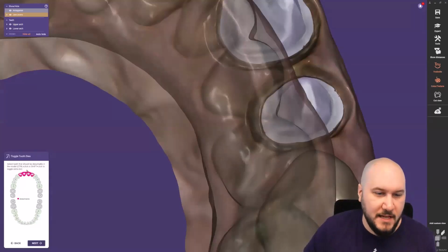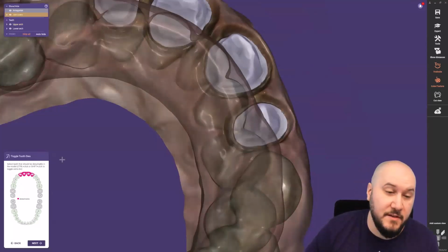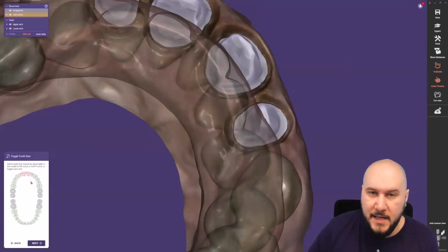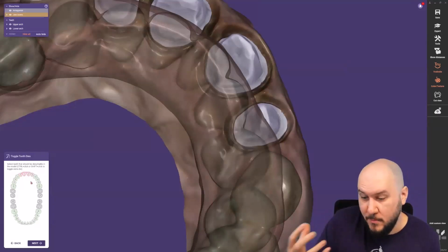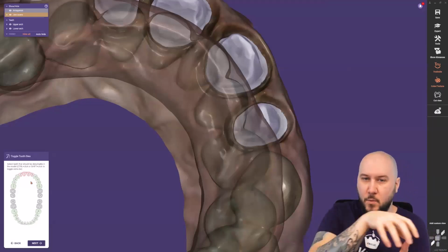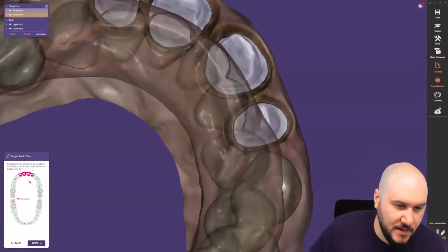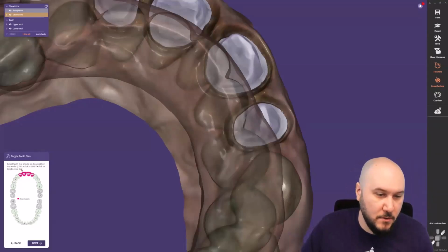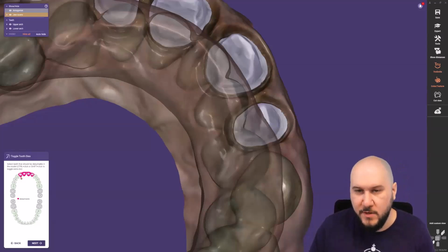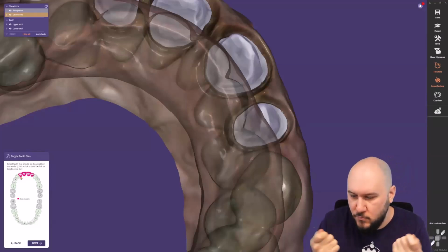So we can select the tooth right away here. You can see that the preset is set up so that we have the normal detachable dies. But I can also make them a normal master model, so these dies are not detachable at the moment. Then they will cover one model without any kind of stumps. But we just want to have them here. Now you can also see the shortcut Control click or Shift click to toggle an extra die. If I do it like this, the software will directly make a copy of the die, and you have a duplicate of this die.